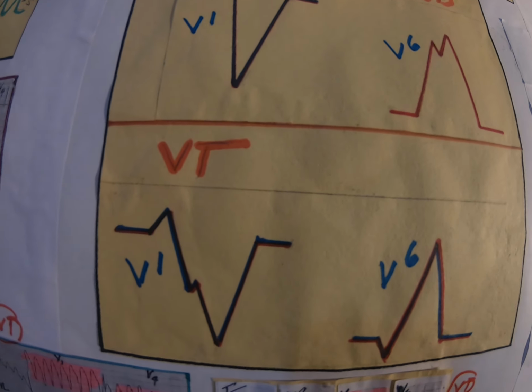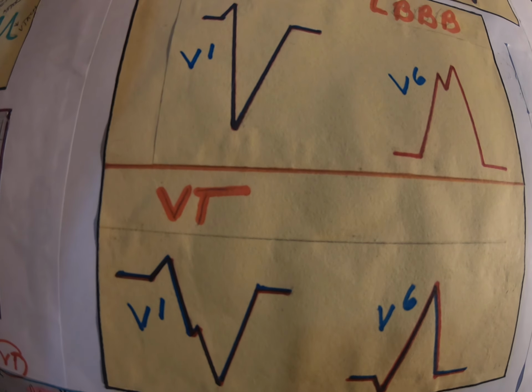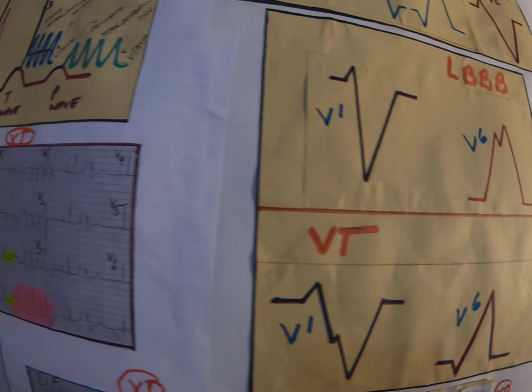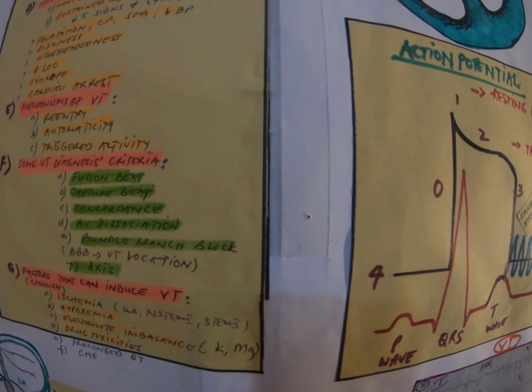Okay. So not all VTAC will show you a good concordance. Some are not. So proceed to these parameters here and check the difference. Okay. So that's for concordance.